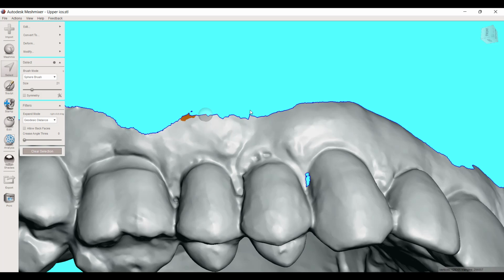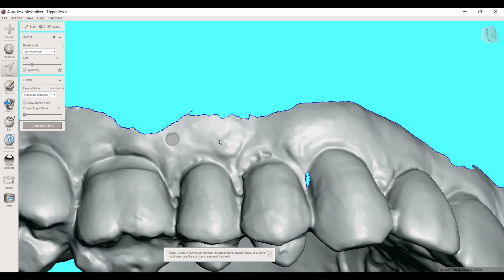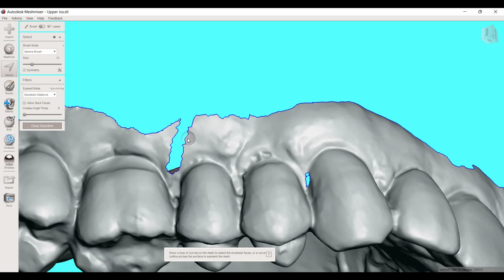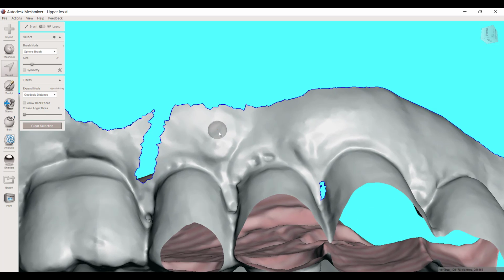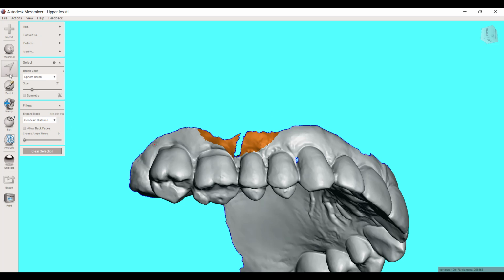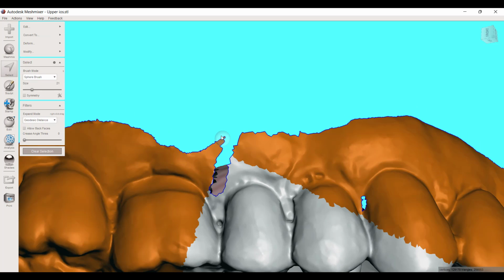We could pick up any little missed triangles, or conversely, sometimes you'll have this scenario where, let's say there's just one area, like a big crack that you've missed, and you wanted to close that. You don't necessarily want to go in and cut out all this data, right? So sometimes you actually have to repair a model, in which case, like right here, we could just select both boundaries.